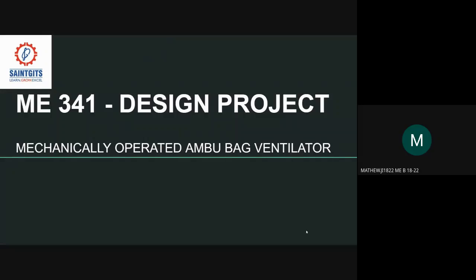Hello all. The project which we have undertaken for our third year design project is a mechanically operated Ambu ventilator.